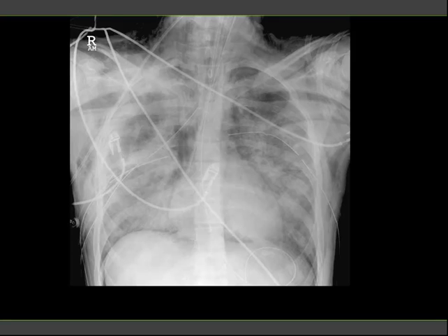Another trauma patient, an adolescent who suffered a severe blunt chest trauma. And you can see that there is basically pneumo everywhere in this patient. There are pneumothoraces that have to be drained, soft tissue air, and a patient who has continued drainage of air from the chest tube requires a CT scan for the underlying cause.